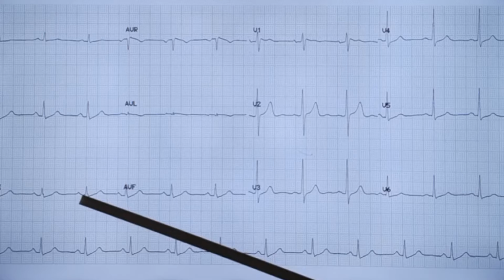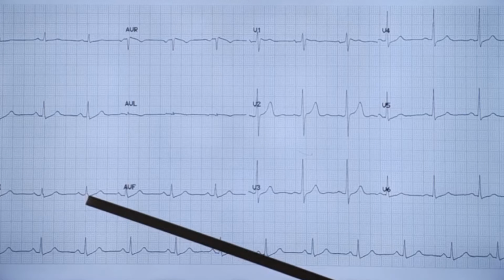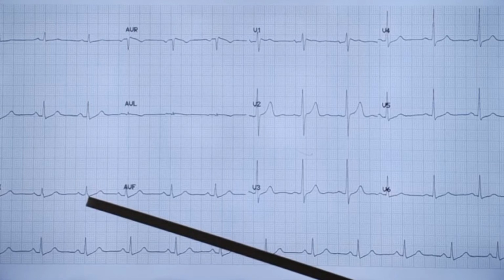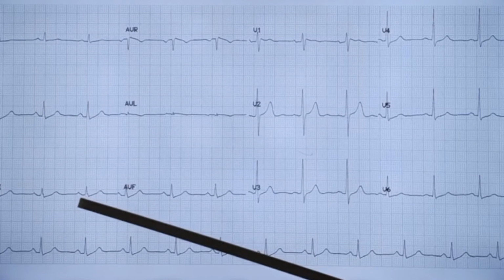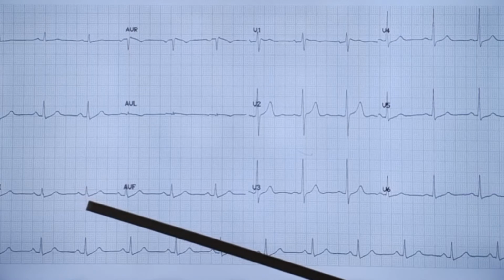So you can imagine that there is a negative TA wave within the PR segment, QRS complex and the ST segment. So this J-point depression of ST segment is partly contributed by the negative TA wave, the atrial repolarization wave, which is not obvious in the surface ECG.